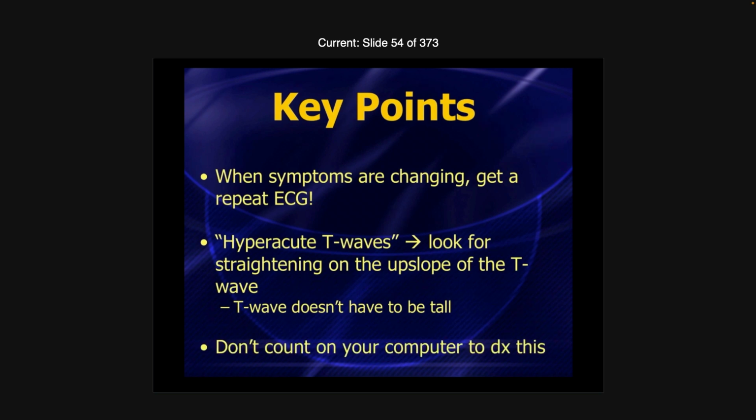Let's go on, and of course, the other point I've got to make, I can't forget: don't count on your computer to diagnose this. I've never seen any ECG computer reliably pick up either type of hyperacute T-wave. If it's profoundly abnormal, profoundly tall, that first type, maybe the computer's going to pick it up, but in many, many cases, all too many cases, your computer is not there to help you out.